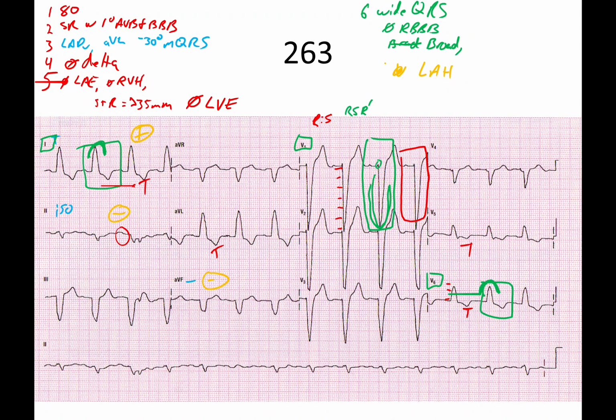And do we match that criteria? And we do. So this patient may very well have a left anterior hemiblock. Now that I've done that, are you scratching your head? You should be, because they have a left bundle branch block. They have a fulminant left bundle branch block, which means that the left anterior part has been blocked out too.